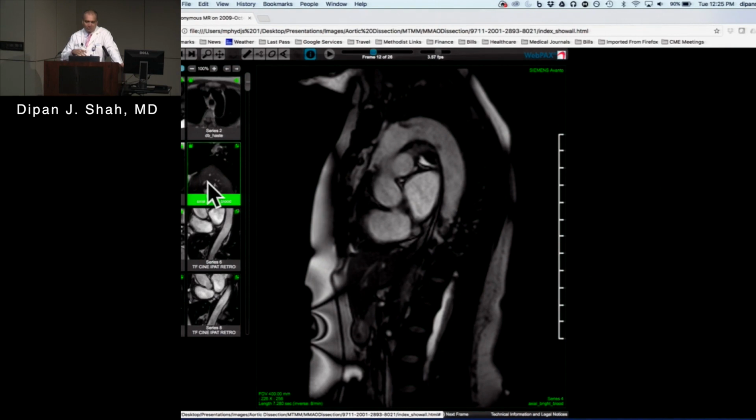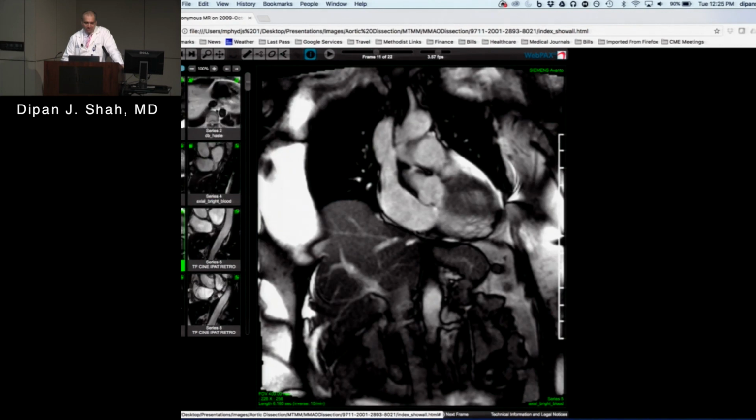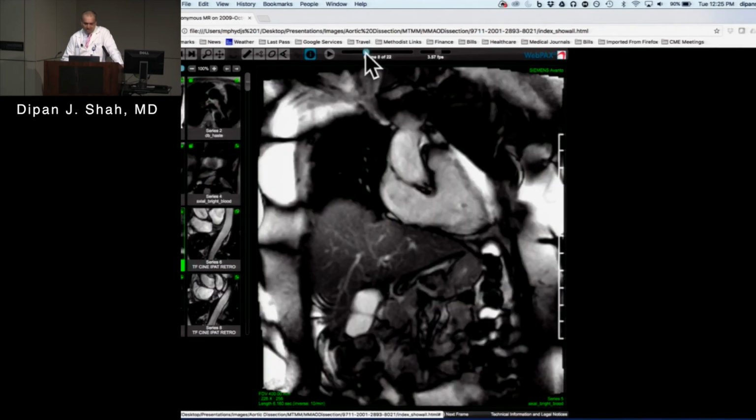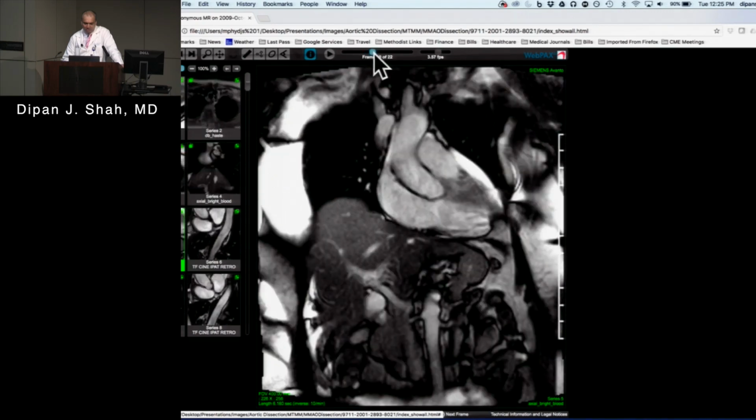There's also, especially if you're on a 3 Tesla scanner, when you're at the edge of the visual field, you can get an artifact that's due to inhomogeneity in the magnetic field as you get to the periphery. But again, this is on a 1.5 T scanner, so that artifact is much less likely as well. And then let's look at one other orientation, which is now a coronal series of images.